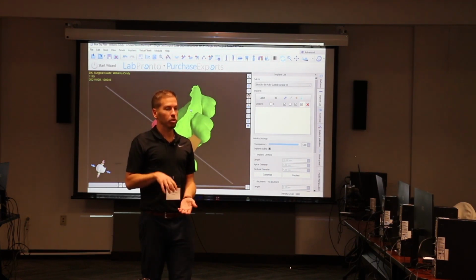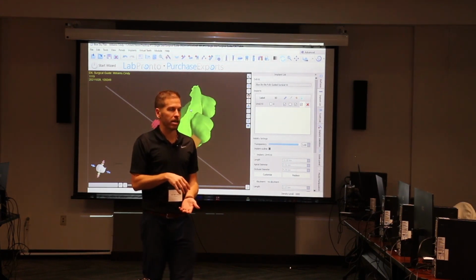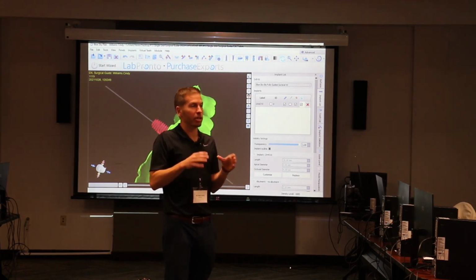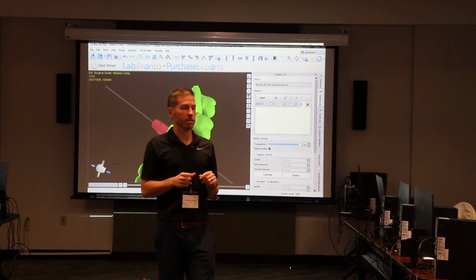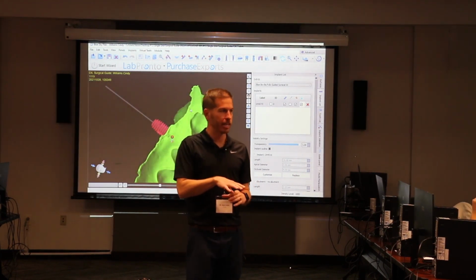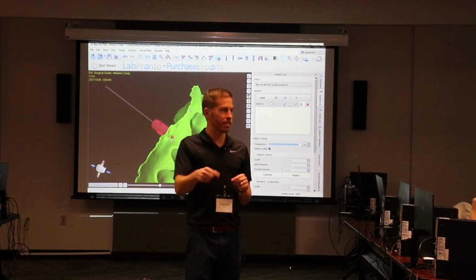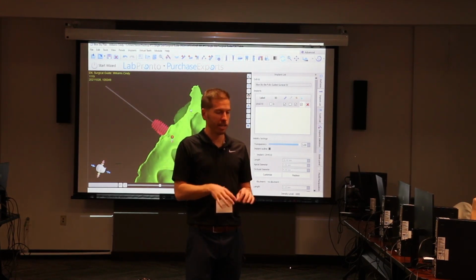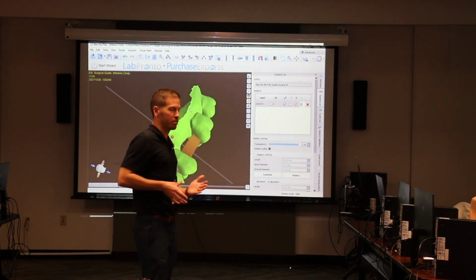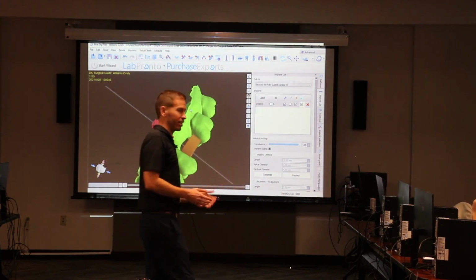If you make it too loose, the metal sleeve's kind of floating around in there. So, again, do a couple prints with a little bit bigger, calibrate. Or some guys use a little super glue, leave it a little loose, a little super glue, slide it in, or a little uncured resin, the surgical guide resin, put it in, and then cure the whole thing together. So in a perfect world, you just press it in and it's friction fit.